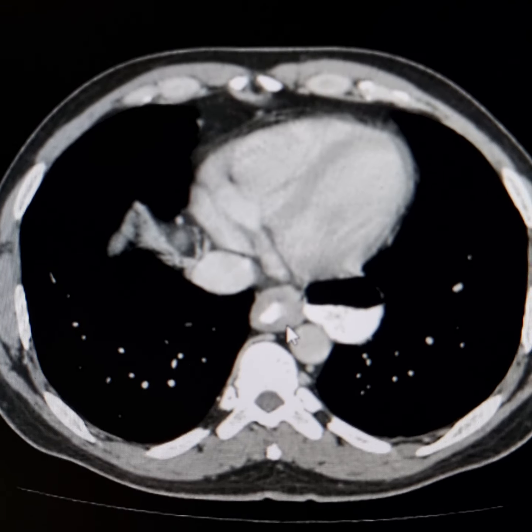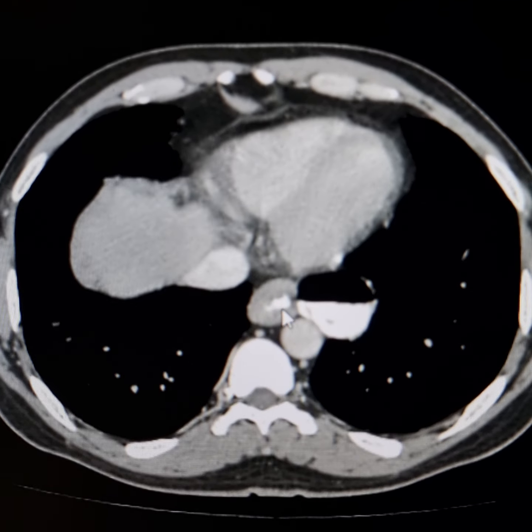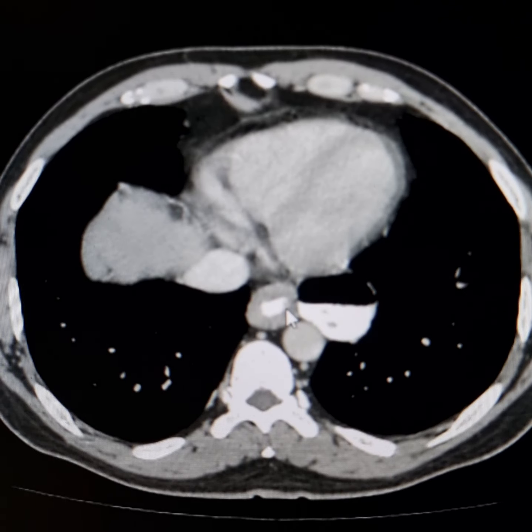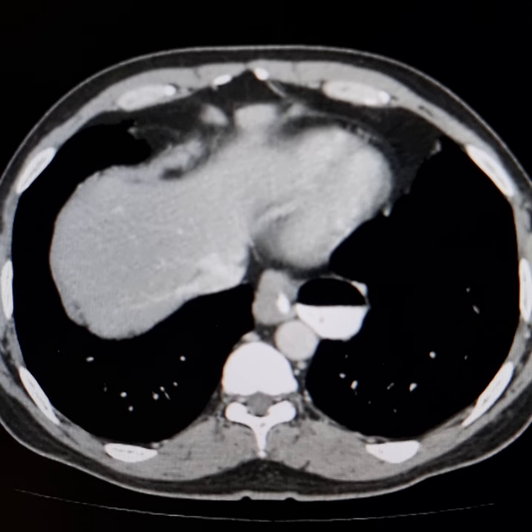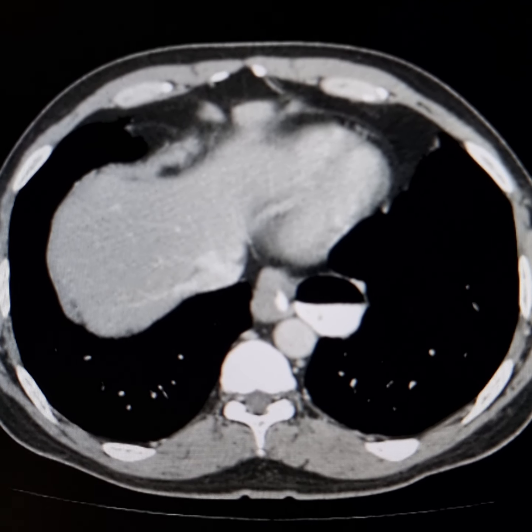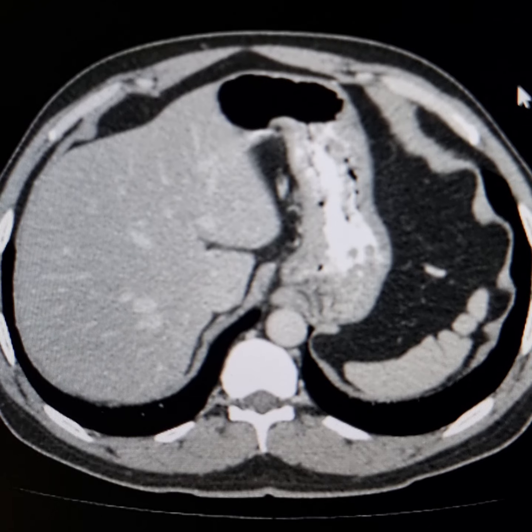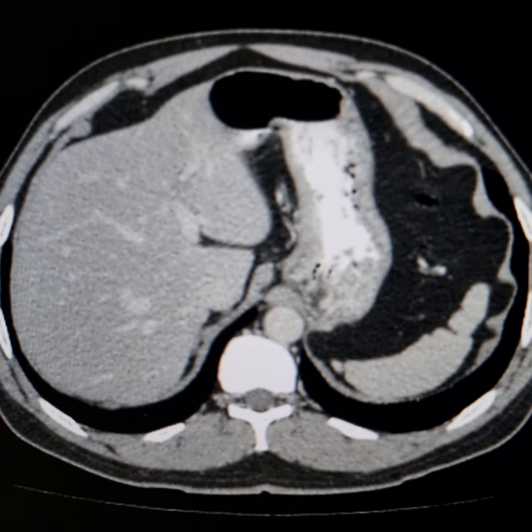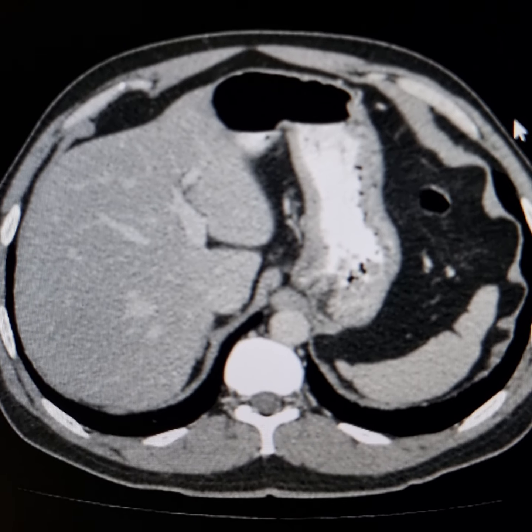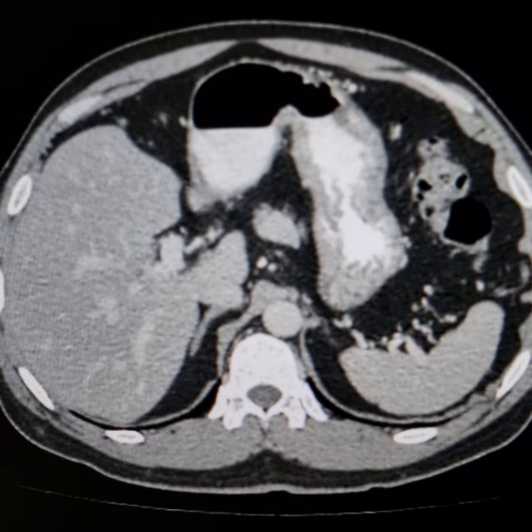Now, this is the distal end of the esophagus below the level of the diverticulum. Its wall is also thickened. Upon endoscopy, the upper part of the esophagus was dilated. Unfortunately, since the CT scan was done for the abdomen and pelvis, the upper part of the esophagus has not been scanned.